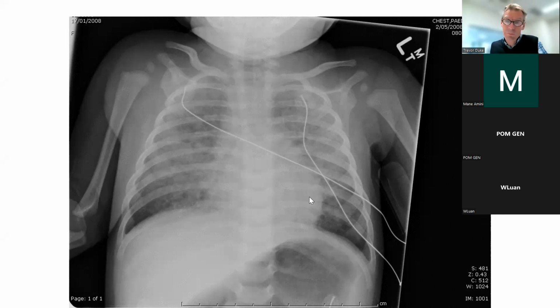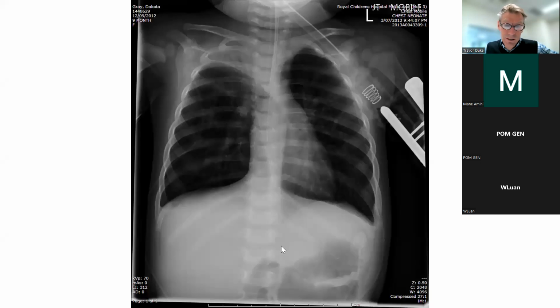It could be a variety of things, but the point is to think, once you see an X-ray, about what pathogens this could be. Okay, that's the way I want you to start thinking. Okay. Now, someone tell me about this X-ray.